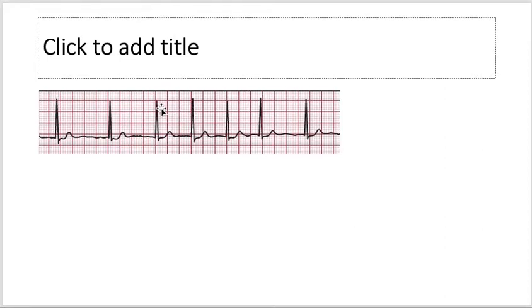The best way, once again, is to find some ECGs, get out the rhythm strip, and look to see whether you can tell if it's regular or irregular. For the most part, you can determine it just by looking at it with the rate, but it is important to describe the irregularity a little bit more.